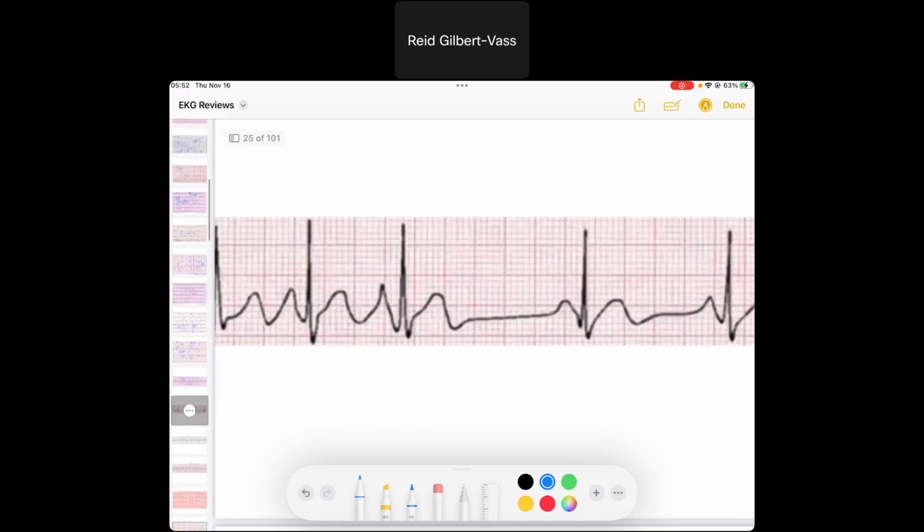We're just going to cross through some rhythm strips right now. Okay, so we've got these beats, and then there's maybe an early beat. If you look at the time between these two beats, it's not right on time, as we would say.